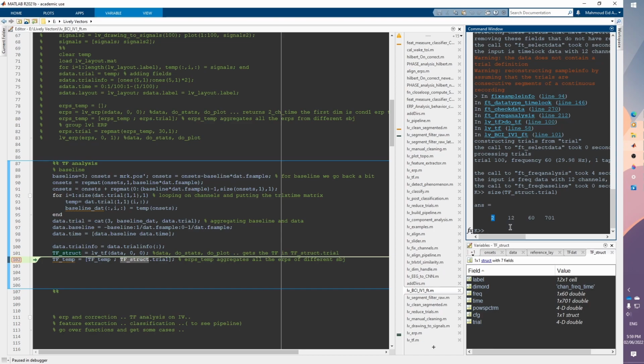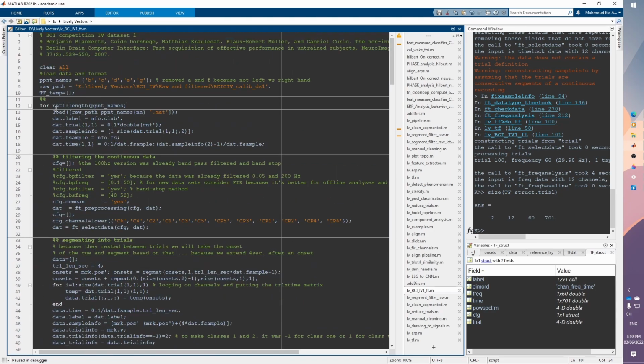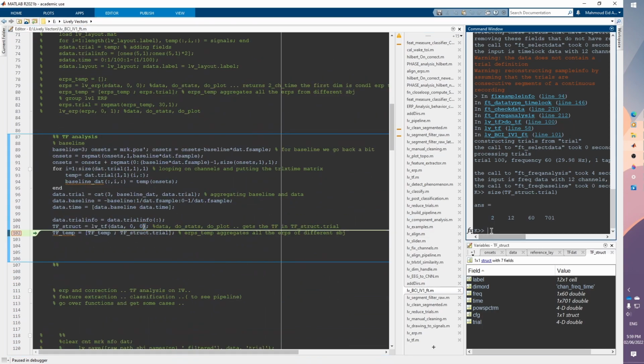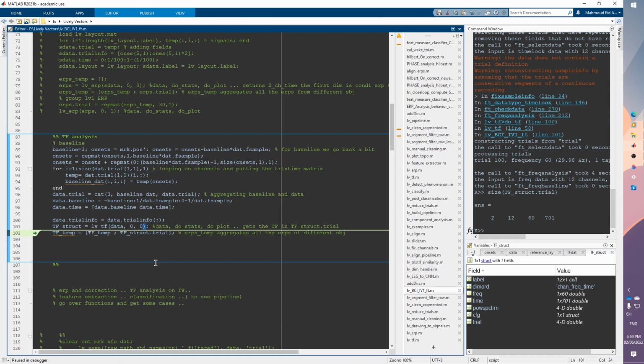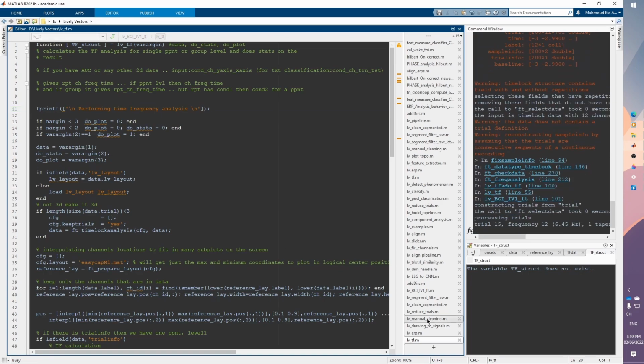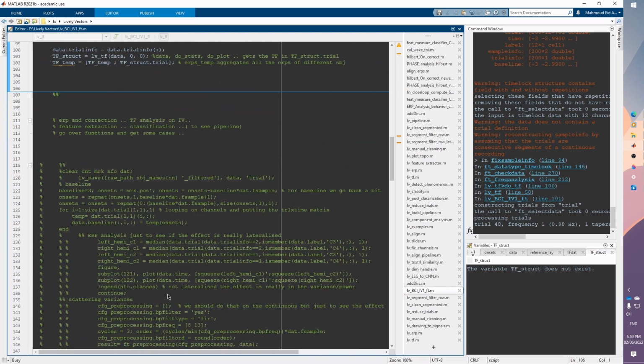Okay, and here we have channel, frequency, time, because we have a time frequency plot, of course, for every channel as well. Here I'm just aggregating everything that we get for this particular participant. If you remember, we are looping on participants, so I'm aggregating this for each participant, so that we can continue and see what will happen when we finish looping on all of our participants.